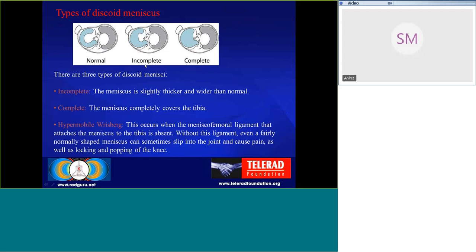So this is the pictorial diagram showing the types of discoid meniscus. This is the normal variant, where we see a C-shaped meniscus. Here we can see an incomplete type of discoid meniscus, which is thicker as well as wider than normal. This concavity is not there in the complete variety. In the complete variety, the meniscus completely covers the tibia without concavity.